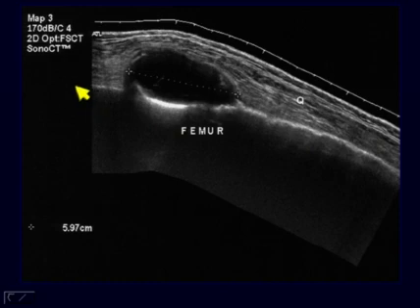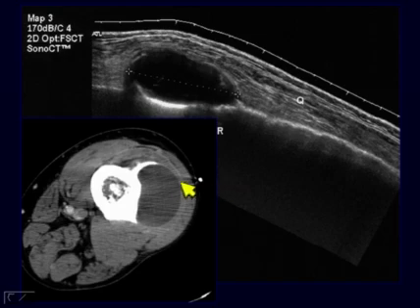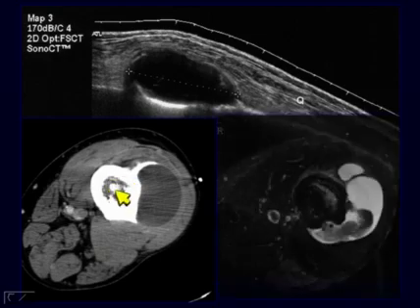On ultrasound, again, the horn-like cauliflower type of appearance persists. But even more interesting is the fluid collection in this individual, again perforating the cortex of the femur. First on CT, the low attenuation corresponds to the echolucent abnormality. Here you see the horns of the cortical remodeling that we already appreciated on the radiographs, and on ultrasound, but again re-demonstrated on CT. But also on CT you could see inside more high-level attenuation that could represent some debris.